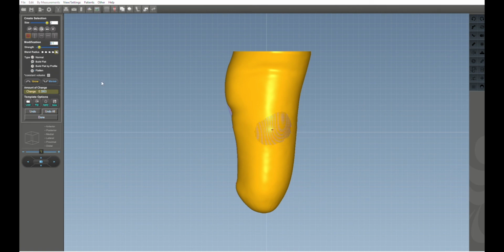So, that's to 4. I'm going to remove that, and I just want to create a little posterior in case the head of fib moves posteriorly. We sometimes see it happen, and I don't want to have to have any pressure there after the stuff is made. So 3 millimeters over there.